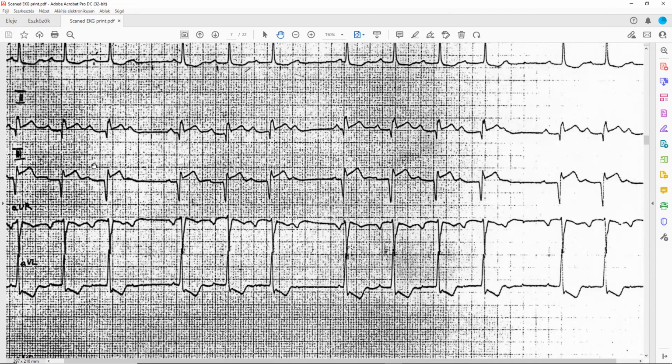But the other ones look kind of rhythmic. That one is not rhythmic at all. You have to look at the longer distance to see whether it's rhythmic or not. Between two beats, for sure, it is rhythmic. But if you look at, for example, 5 or 7, it's not rhythmic. Yeah, that's true. I counted the beats per minute being 72.